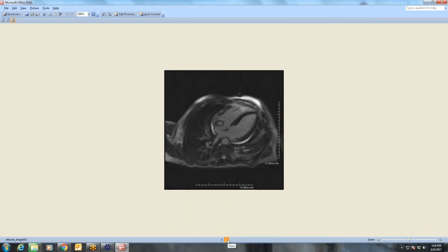And I don't want to go into the physics of it, but you can see here on the shorter inversion time of 300, which nulls myocardium, you should see delayed enhancement for anything that has some degree of gadolinium in it. It still hasn't nulled yet, but when you go later, at a much later time, you see it starts to null, and that's pretty characteristic of thrombus. We have a bunch of these cases and have had pretty good accuracy diagnosing thrombus this way. So this was a thrombus/vegetation.